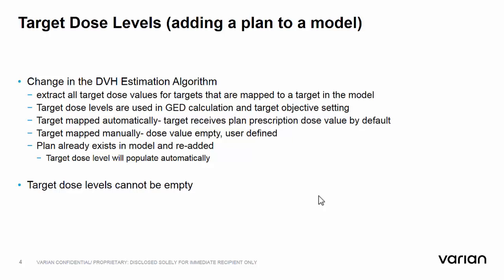If the plan already exists in the model and the plan is being added again, the target dose values of structures mapped to a target are retrieved from the model and populated in the dialog.